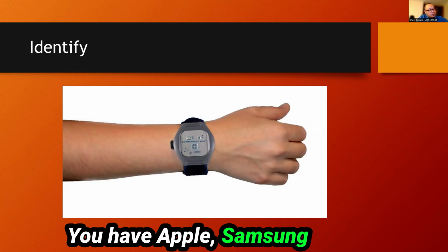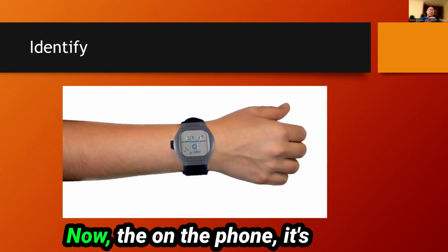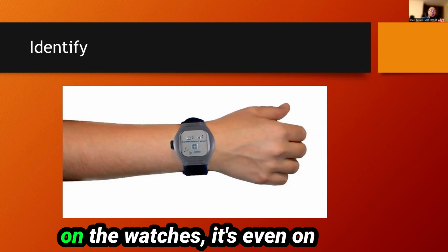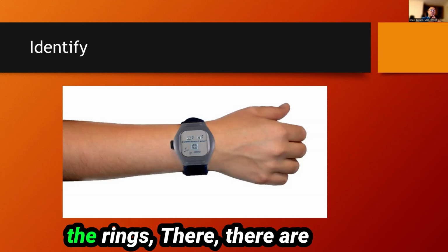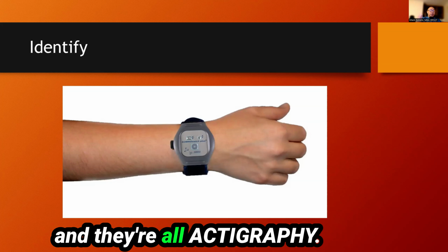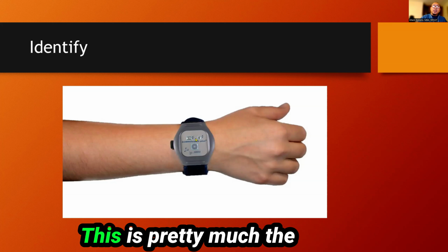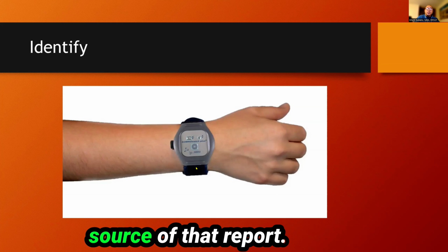You have Apple, Samsung, Amazfit, all that. All of these devices now, on the phone, on the watches, it's even on the rings. There are some that are only bands, and they're all for actigraphy. But this is the report that we saw earlier. This is pretty much the source of that report.